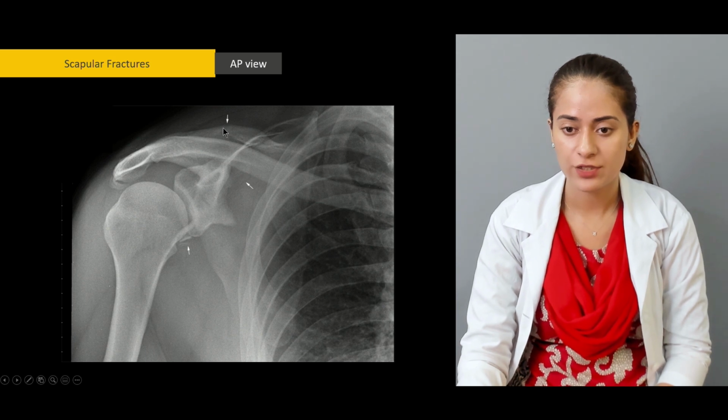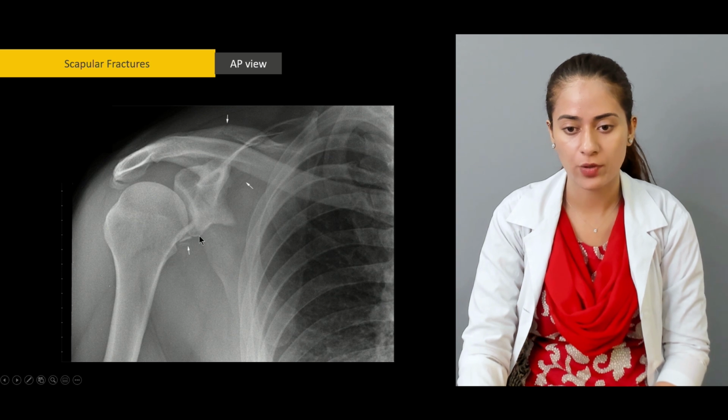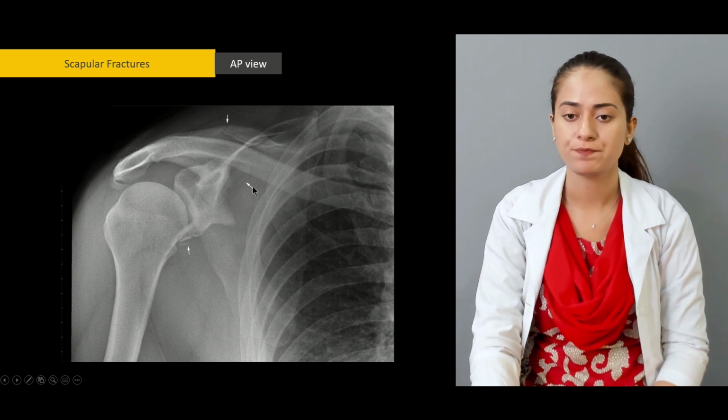this is a fracture, and then here, this is a fracture line going through this entire area, going up to almost touching this fracture. And this is the fracture here of the inferior anterior labrum, which is also called a Bankart fracture. So this fragment has been dislodged here. So it's a dislodged fragment of the labrum. It's probably dislodged from this position here. So these are the 3 sites of fracture of the scapula.